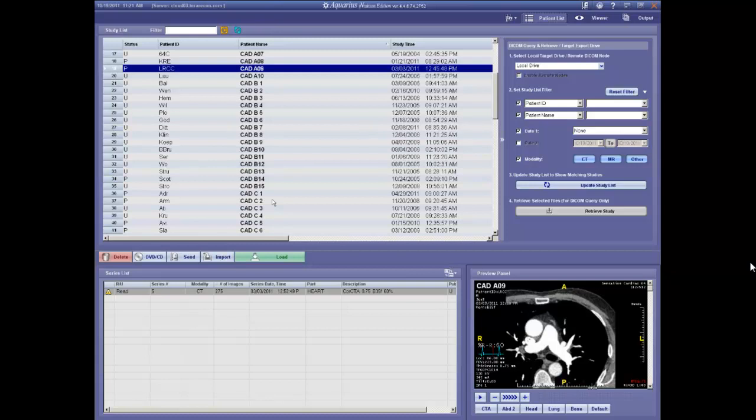And on a good calcium score study at lower resolution, just a non-contrast study, the apparent severity of that might have appeared even greater. But nonetheless, that's a study which we can do and read with a very, very high degree of confidence. And I would predict that if this guy was actually cathed, we'd see absolutely nothing there except fluoroscopically, maybe a few flecks of calcium if we look closely. So this is just surely a non-obstructive lesion. In fact, probably one which wouldn't even make the radar of a careful inspection of a direct angiogram.